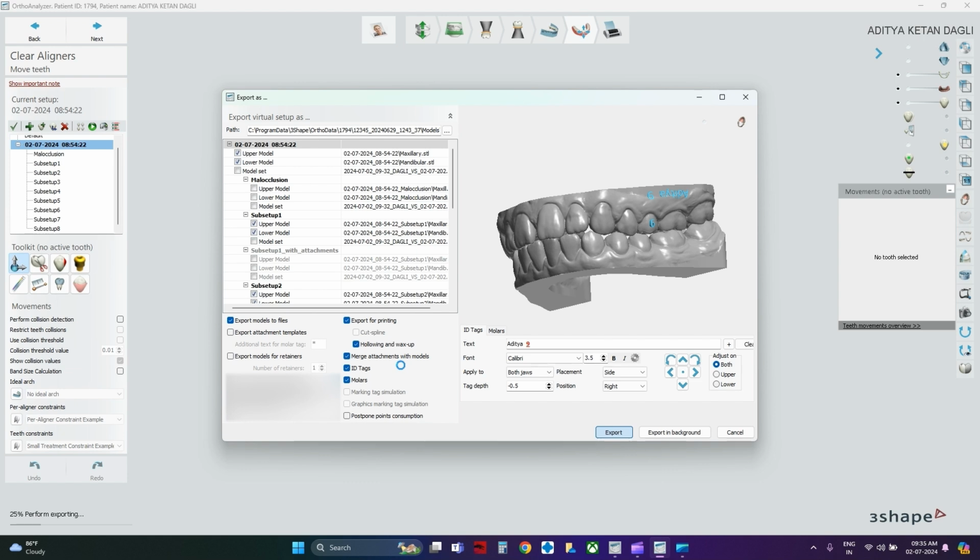And if you feel that it makes your life easy, then it's your choice to select whether to spend that money and use that time to do something else. Or if you definitely have someone to do that for you, and you can employ someone who can do that and it can free up your time, you can definitely do that and not use the auto segmentation feature, and get those things ready by an associate or another staff who's qualified enough to perform those steps for you, and you can focus on the planning part.